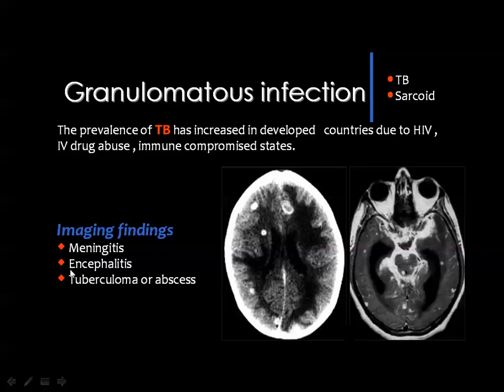The meningitis is similar to any other form of meningitis. There is diffuse leptomeningeal thickening and enhancement of the basal cisterns, as you can see around the ventricle, and you see here and there. And in order to specifically diagnose this as tuberculous meningitis, you should see some tuberculomas inside the brain parenchyma. Then you know that this is tuberculous in etiology.